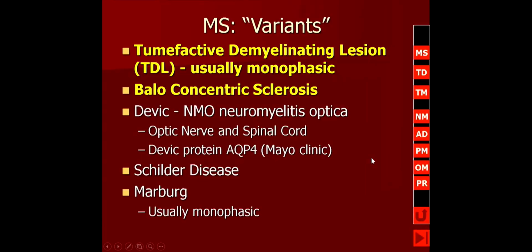Let me talk about tumefactive demyelination. I have a good friend who's a neuropathologist at Johns Hopkins, and there is a rad path course that we do together, and every time he gets up, he sees me in the audience and he yells at me. He goes, "We should never see histology from tumefactive demyelinating lesions. This is the problem with the radiologist making the incorrect interpretation." And then he proceeds to show a bunch of lesions that were biopsied.